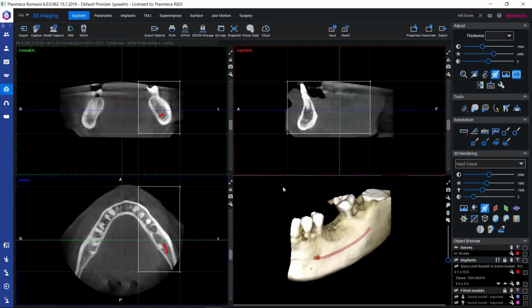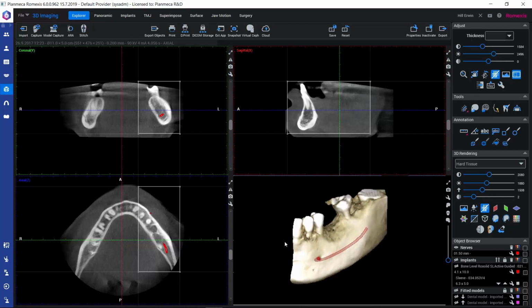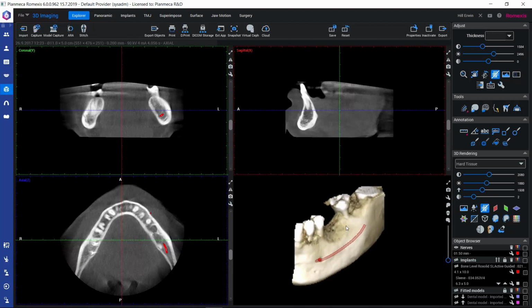So this allows us to view just the part of the volume here in the 3D rendered view. We can then deactivate this cropping tool, and we could work on the data in this way. And if we would like to get rid of this cropping, we could click here on Reset View in order to get back to the original full volume here. And like we see, this cropping didn't apply on the slice views.